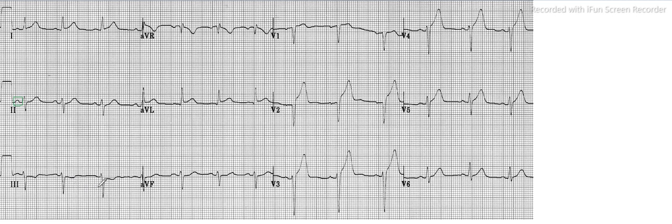I think it's a bit irregular or something like that, so we need to confirm it a bit nicely. 1 2 3, here it is more than 3.5. Here it is also 1 2 3, more than 3.5. And here 1 2 3, so 3.5. So it is almost regular.